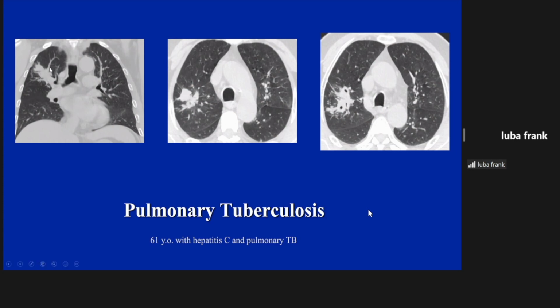When we're looking at the CT images in lung window, the coronal reformatted images and the axial slices here, it sure looks like a mass with spiculated borders, maybe partially obstructing bronchi of the right upper lobe, as we also see on the coronal reformatted image here. Looking a little bit lower down, it looks like there's some cavitary component to it. And in addition, there are not only spiculations, but a lot of satellite nodularity.